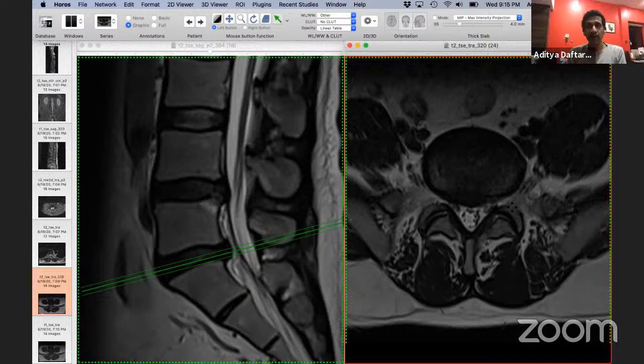You look for edema around the facets to tell you if there could be an element of facet arthropathy, which is acutely a cause of pain. And then you look at the nerve roots themselves to see if they're being impinged by that or not. And then last but not least, go back and have a second look at the bone itself to look for pars defects and things like that. And then finally, make sure you look at the extra spinal structures, so the sacroiliac joints, the hips, etc., which are important in your management thereof.